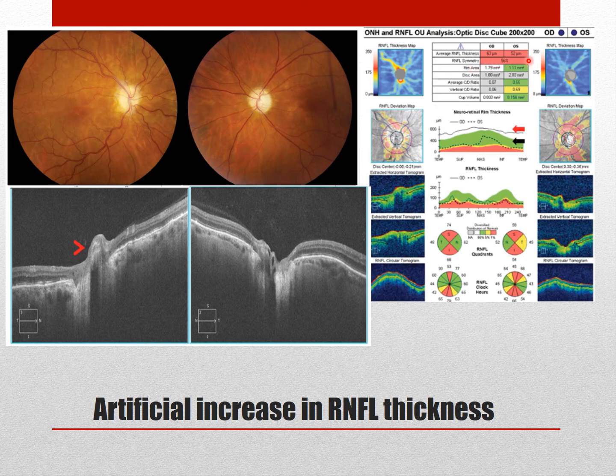Okay, so you see the red disease. Let's see if it's true red disease. In the thickness map, you see definitely there's great loss of nerve fiber, and that can be translated here, right? All around here, nerve fiber loss.